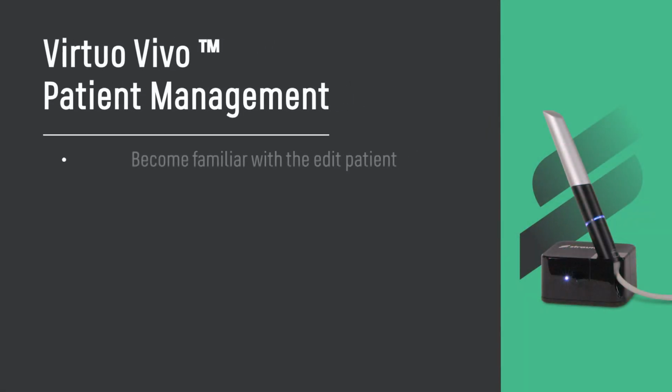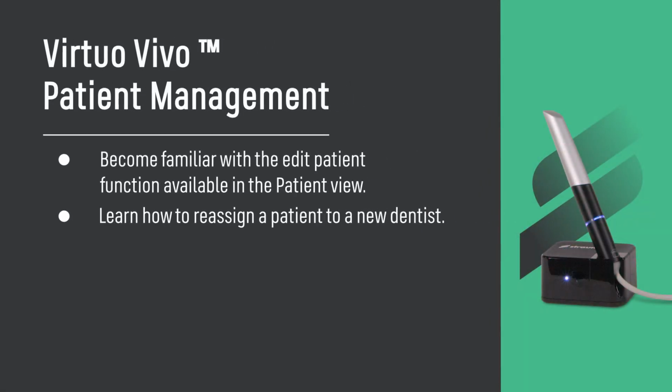Virtuo Vivo Patient Management. Become familiar with the Edit Patient function available in the Patient View. Learn how to reassign a patient to a new dentist.